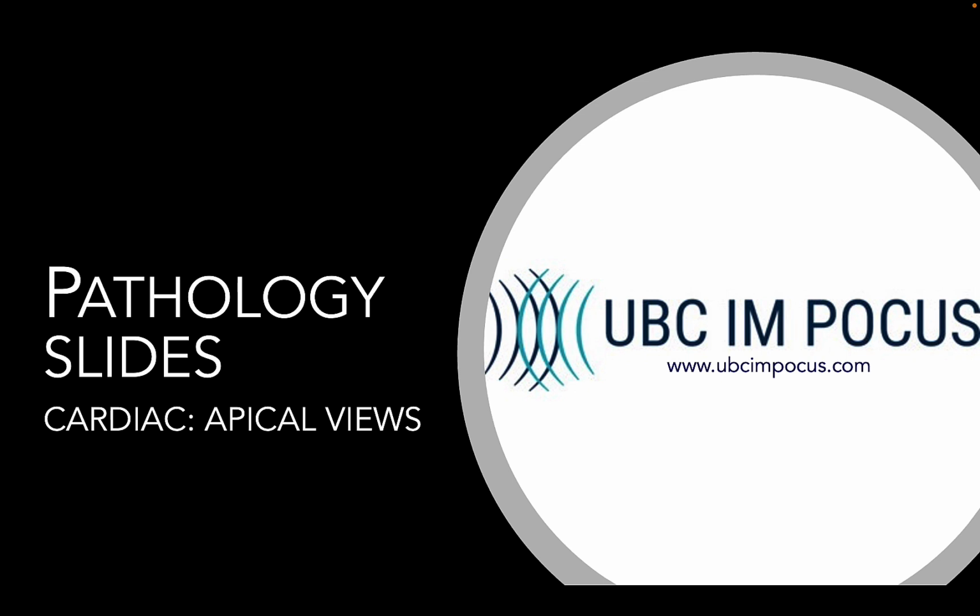As a reminder, these videos are intended to give you a sense of what abnormal looks like because often we learn these techniques when scanning normals, but it's important to get a sense of what is not normal so that you can identify it when you see it in your patients.